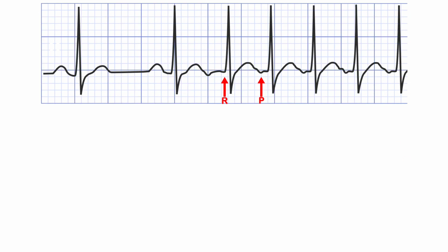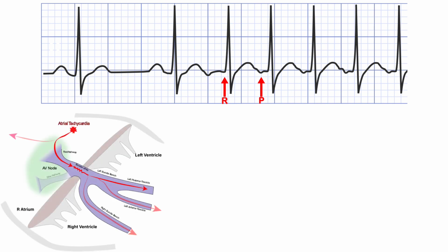Finally, let's look at the case of a long RP tachycardia and play through all the scenarios. In the case of atrial tachycardia, this could be an atrial tachycardia if this P wave represents atrial activation followed by ventricular activation. Although most would say this interval is far too short to represent a physiologic PR interval, it could be long enough, it's hard to say.